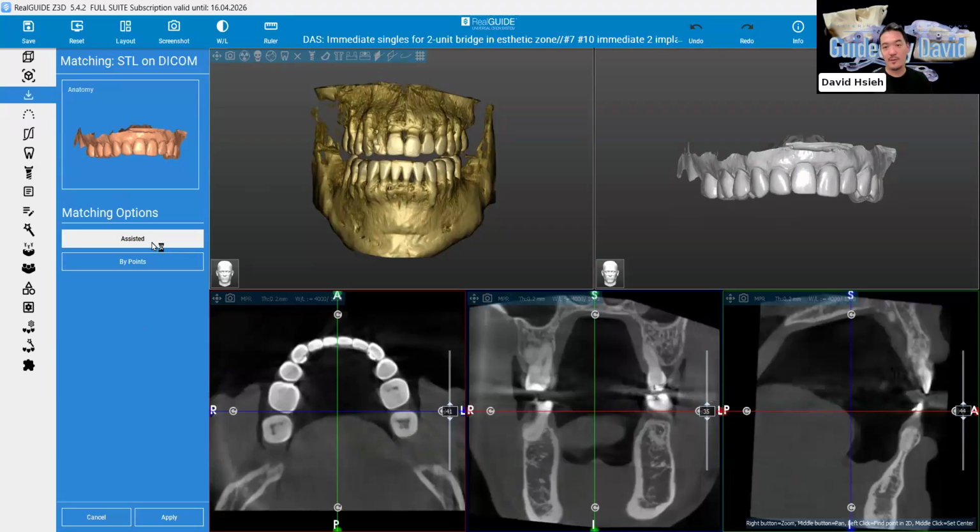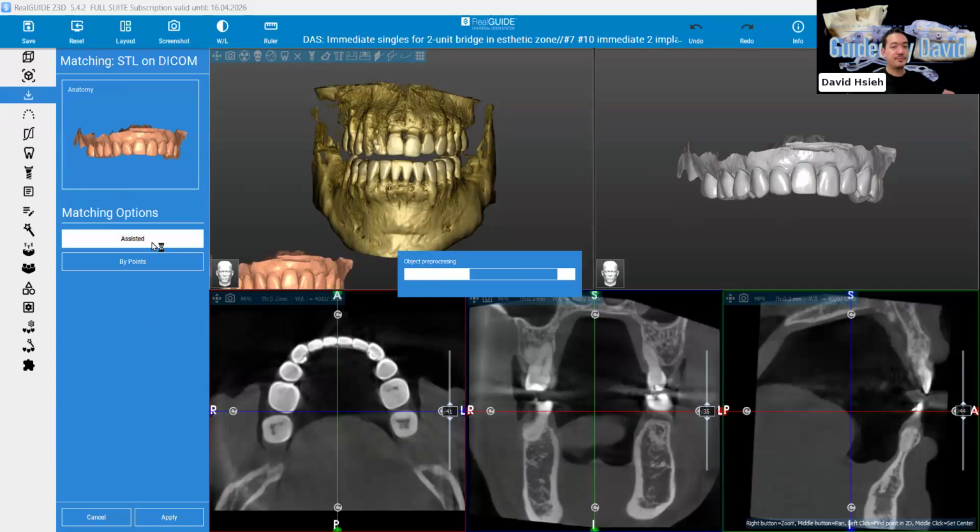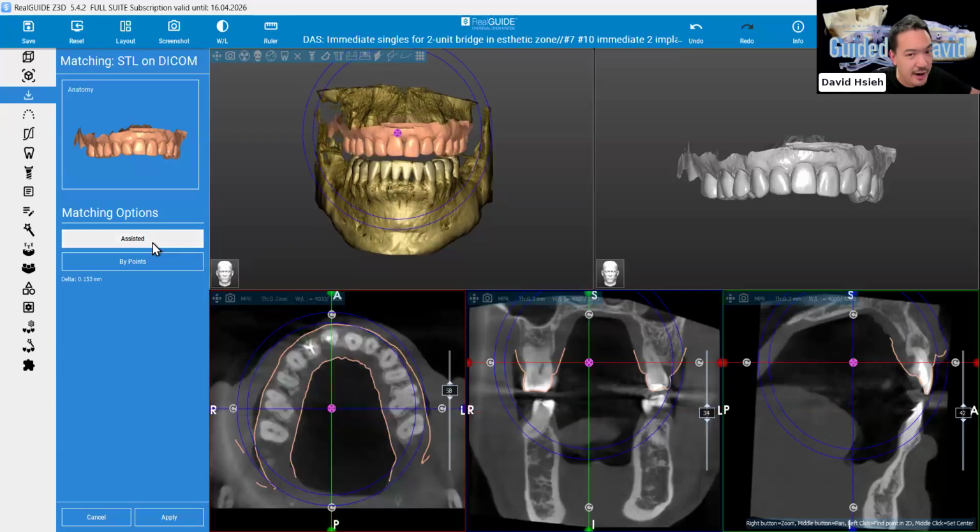If you click that, the computer will start to think. We just keep running. It'll take some time for the computer to think through it, right? All right, I think we're there. So it merged in like 10 or 20 seconds. I mean, faster than I do it manually. So let's see the result. Is that going to be a good merge?